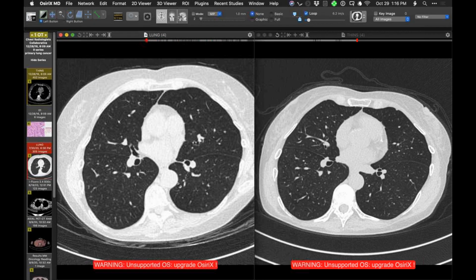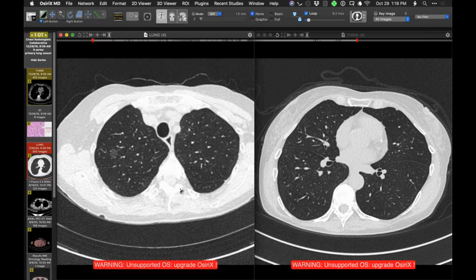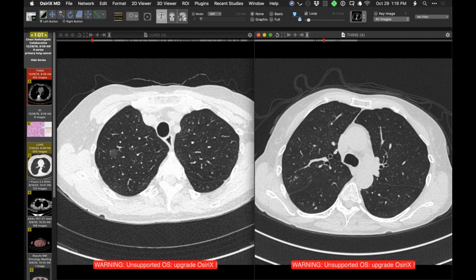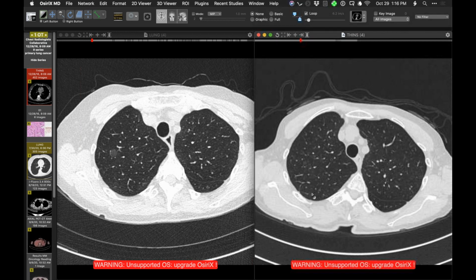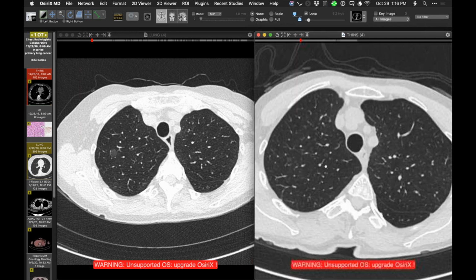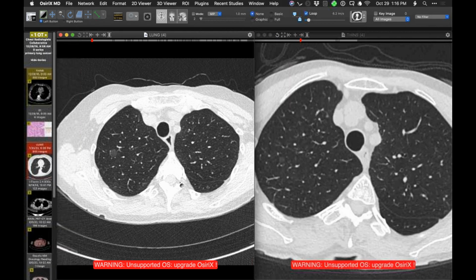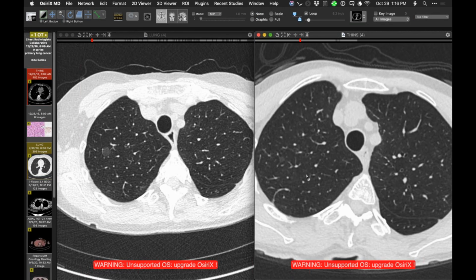And I'm not sure what happened, but they did a follow-up, which is obviously quite a lot later. So here is the one that attracted most attention. I'm not quite sure why, maybe because of its size. So let me just make this one big. So this one compared to that one. And you can see the change in size.